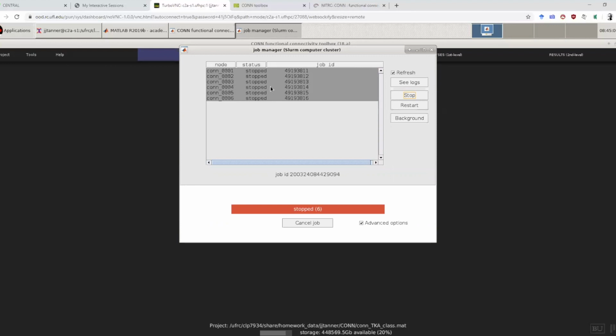So it splits up the brains into 6 different jobs. So in here we have 10 brains. And so most will have 1 brain, but some of the jobs will have 2 brains that they're doing, and or parts of jobs, and you have to put that all back together. Or CONN will do that automatically, but it's possible that you can get that waiting to do that when you're here doing the next step.